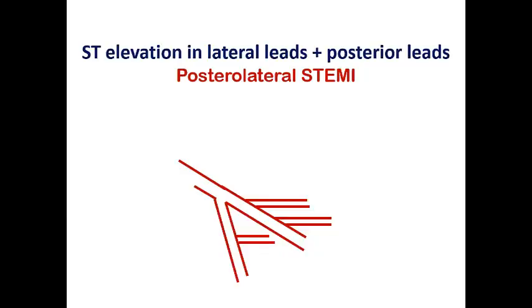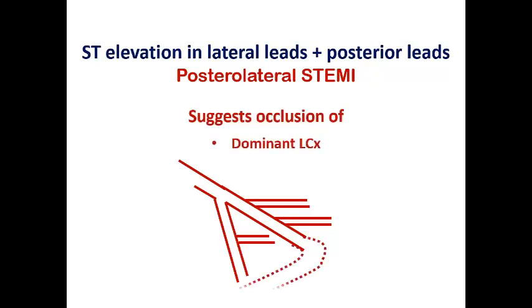Also another possibility is ST elevation in lateral leads and posterior leads, which we call posterolateral STEMI. Also, it is a possibility of a dominant LCX resulting in infarction in the lateral wall and posterior wall.